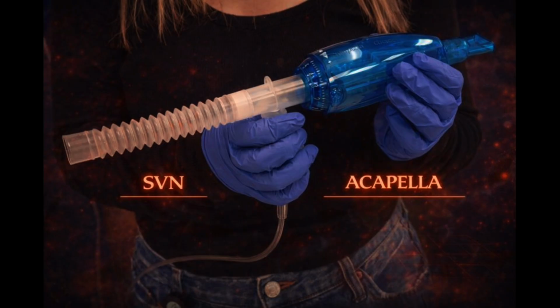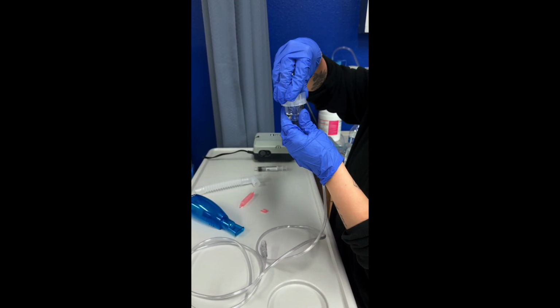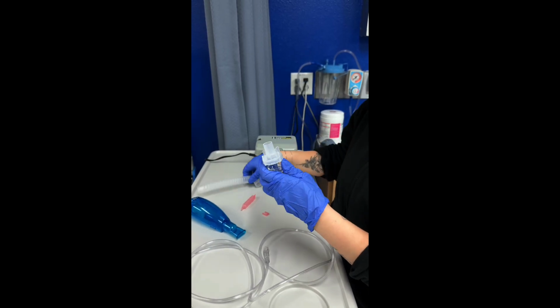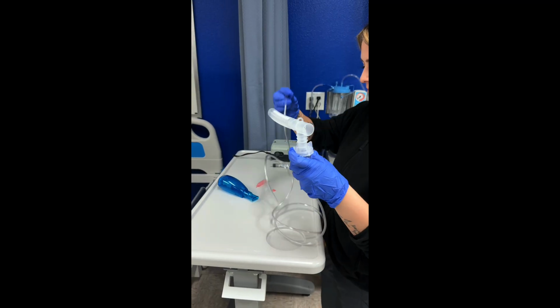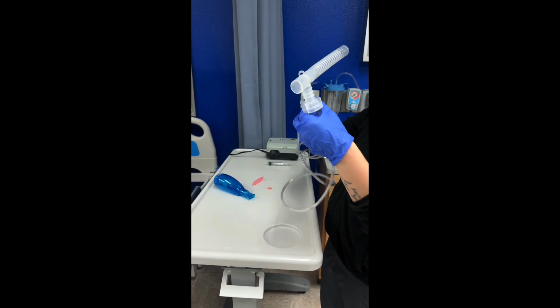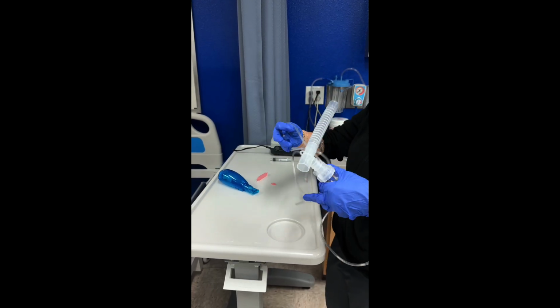Now, I'm going to explain how to properly set up and use a small volume nebulizer with an Acapella PEP device together. First, I gather all required equipment, which includes the nebulizer cup, prescribed medication, Acapella device, mouthpiece, and oxygen or air tubing. I begin by adding the prescribed medication to the nebulizer cup, ensuring that the total fill volume is appropriate, which is typically 2 to 5 milliliters. I then securely close the nebulizer cup.